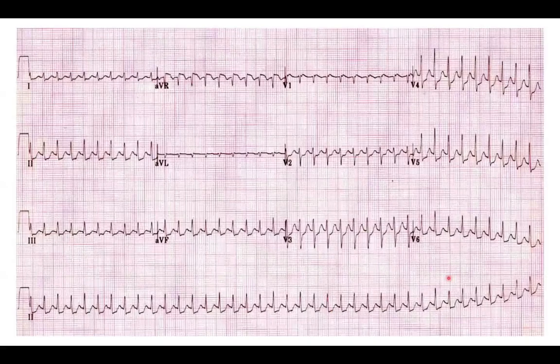All right, and then our last one here, same as before, just go ahead and pause.